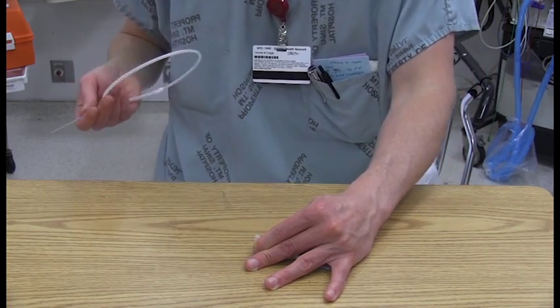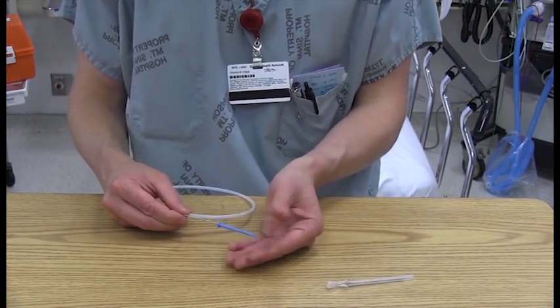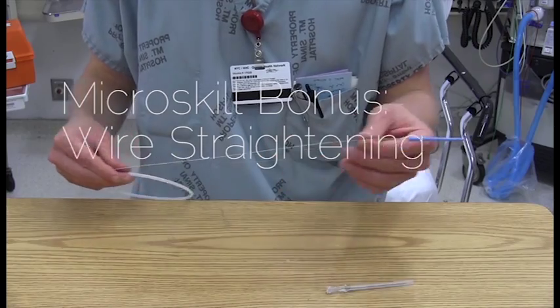And that's really the hard parts of central line placement. Those are the micro skills worth learning. The rest is just understanding the procedure. Now there's a few bonus micro skills.